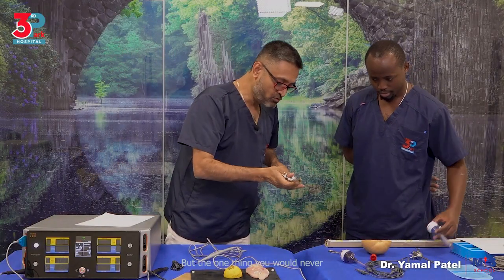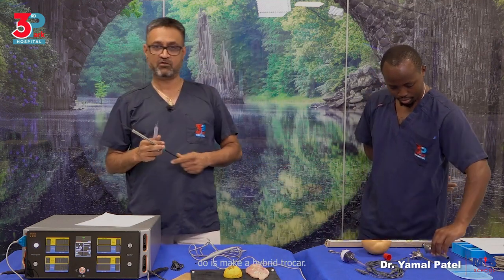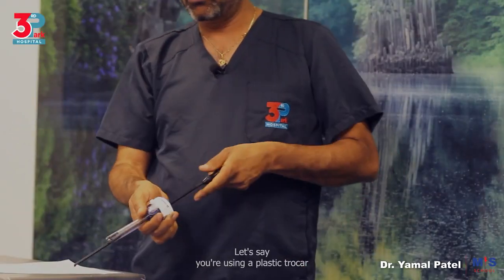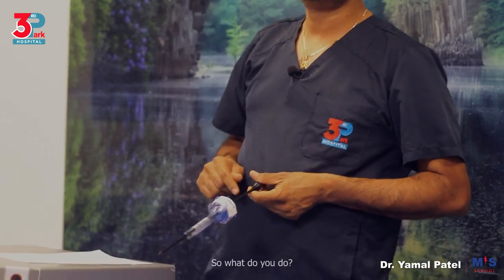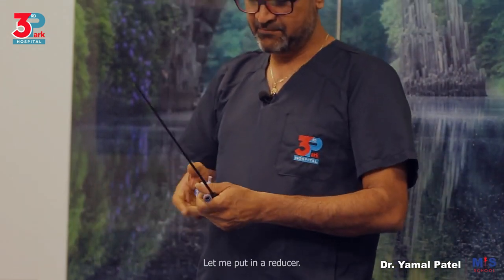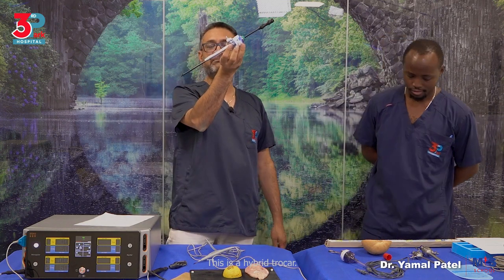But the one thing you would never do is make a hybrid trocar. So what is a hybrid trocar? Let's say you're using a plastic trocar and this is leaking. You would think, this thing is leaking, it's making noise. Let me put in a reducer, a metal reducer, and you do this. Now this is a hybrid trocar.